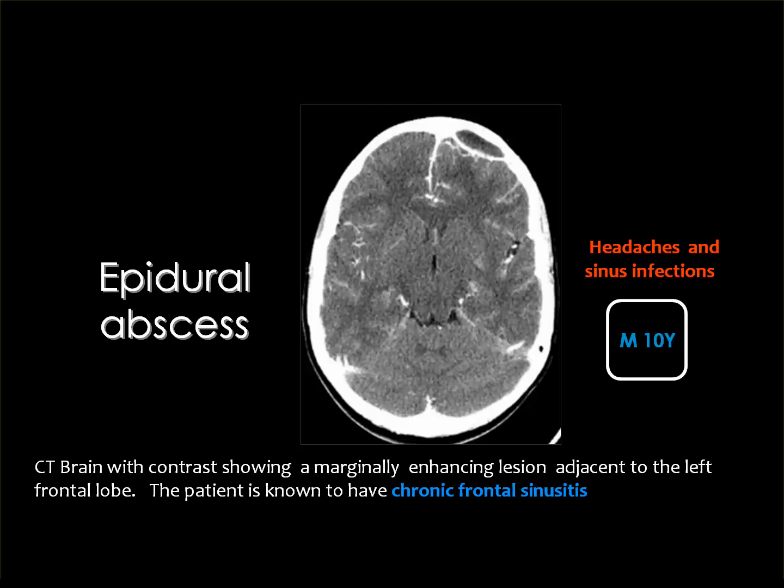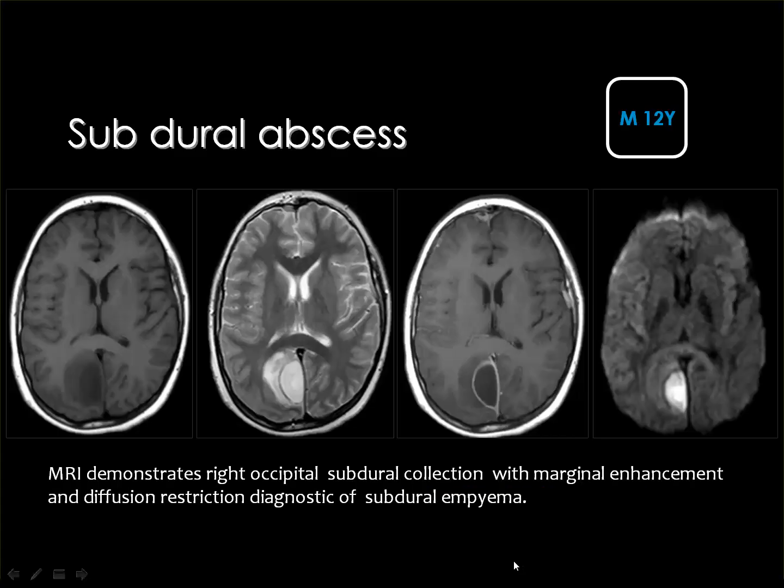Epidural hematoma will not enhance with contrast material, even in the chronic phase, when it is black. Epidural hematoma needs a history of trauma, is usually hyperdense, and sometimes it may be hypodense, but it will not enhance with contrast material.